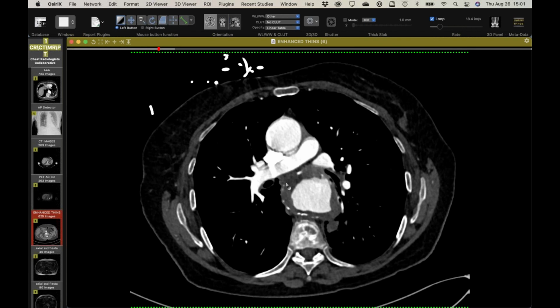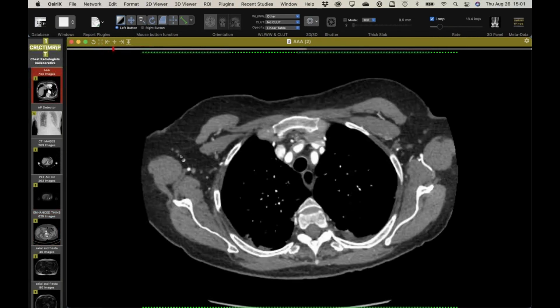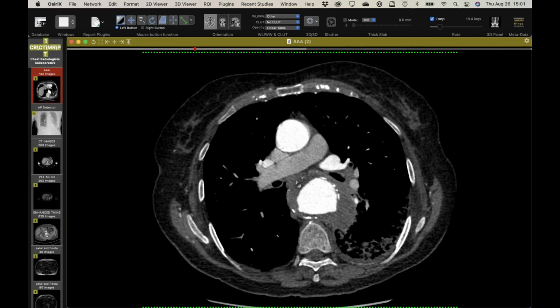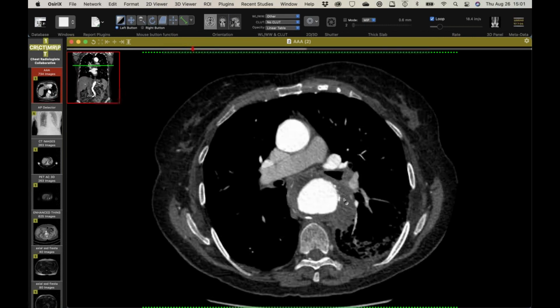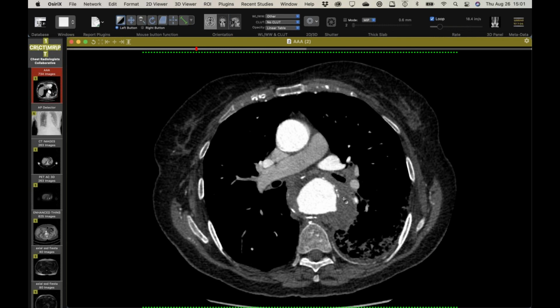Here, the other thing that I also favored, let me go back to the newer scan, that this was aortic, was just the fact that you have all of this plaque going all the way around. It's patchy, but as you scroll through it, it's pretty much there. Yet there's nothing here, which, if there's an intact wall, you'd expect to see some clot. You don't. And then this little beak right there points to this being aorta. So, cool. Well, thanks for that.